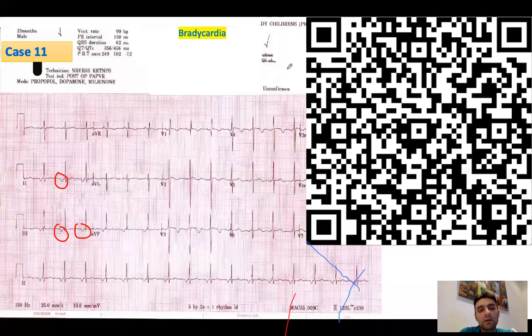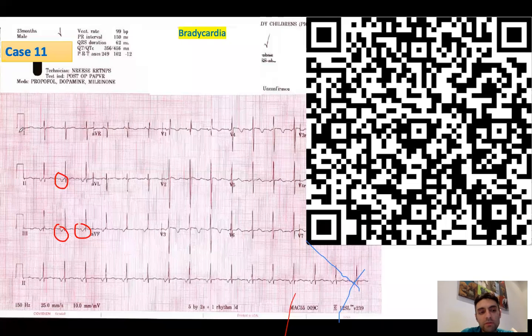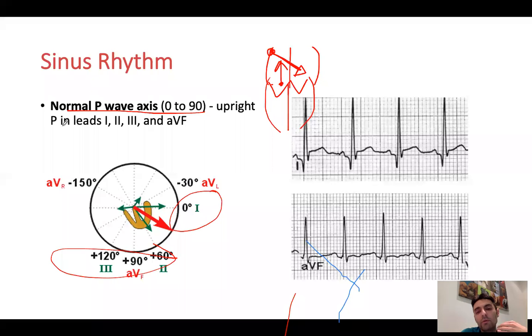So definitely a low atrial rhythm. In this case, right, because the P wave is positive in lead 1, so you know it's going right to left. So low right atrium. Makes sense, guys? So P wave axis is very important.